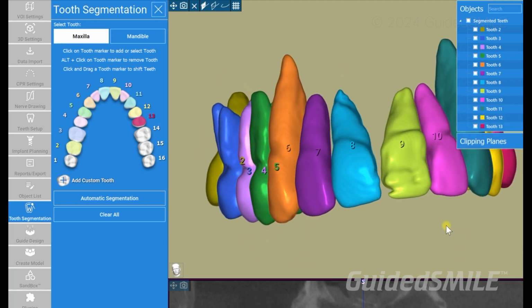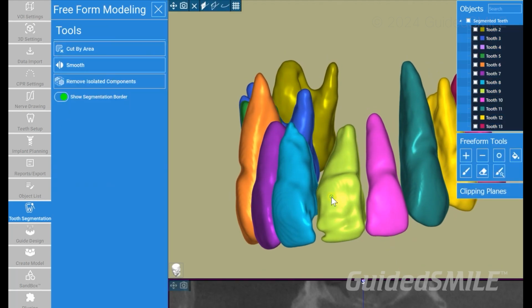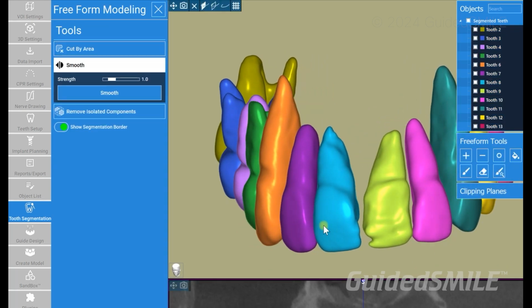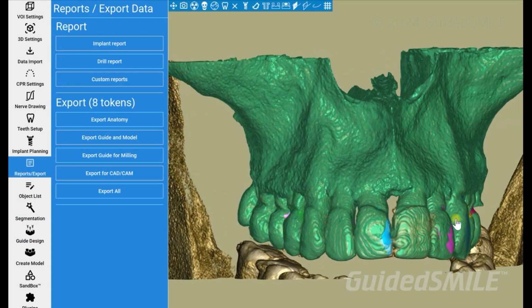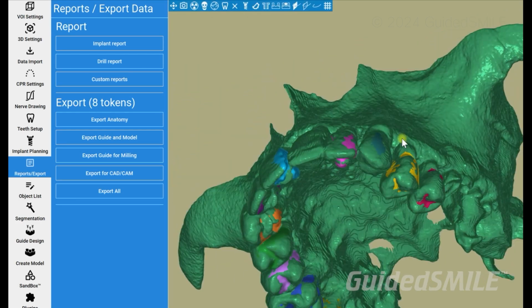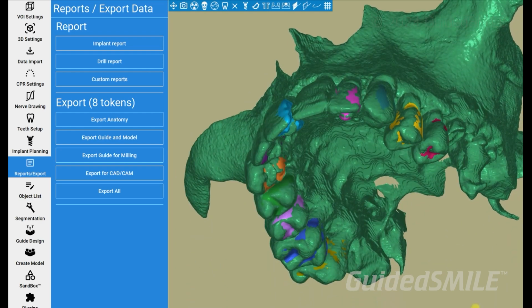This will be available in the digital dock, which is the least expensive. It's the most affordable version of RealGUIDE. RealGUIDE's free, but then if you want these special tools in there, then you'll get a paid version of it, and you get this wonderful segmentation included.